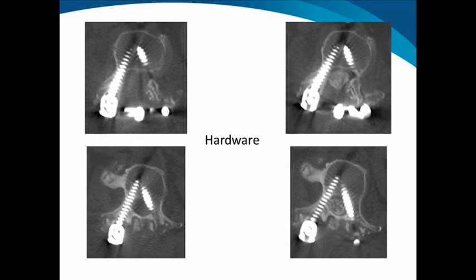Here's an example of conventional myelography that might be performed at an outside community hospital. Just a brief review, a myelogram is subarachnoid contrast, which outlines the nerves of the cauda equina. On the left, you can see spine hardware from a fusion procedure producing extensive metallic artifact, which obscures the spinal canal and makes for a difficult visualization of potential problems such as intervertebral disc herniations. On the right, you can see with the post-myelogram CT scan, subarachnoid contrast shows the nerves of the cauda equina.